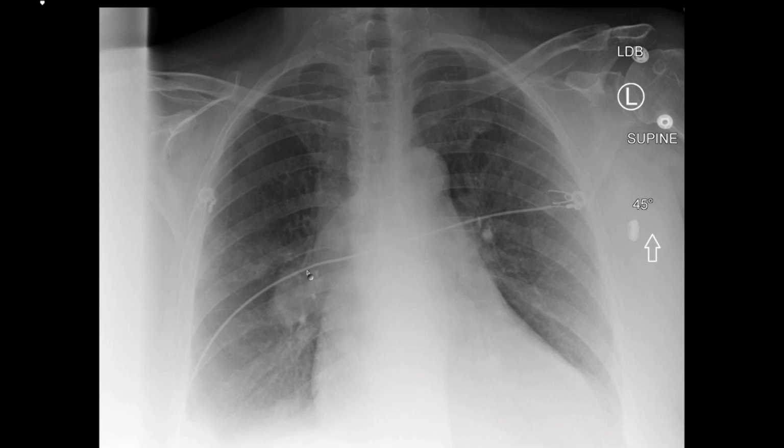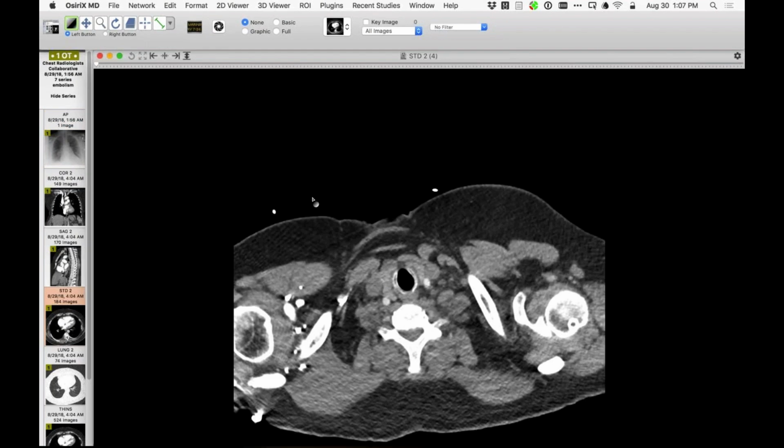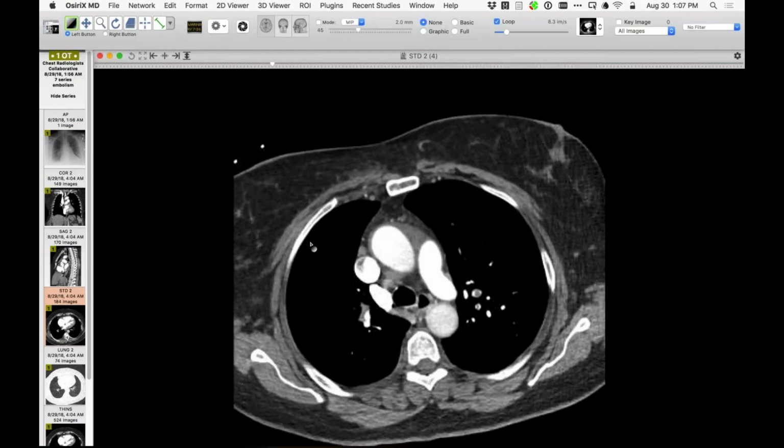The distended pulmonary arteries, if it was right over there, would be the Fleischner sign, but certainly this involves the proximal descending right pulmonary artery, so it should be the Palla sign. And then, of course, because of right atrial hypertension and a big pulmonary embolism, the distended SVC and azygos vein reflect that very nicely. So yes, indeed, this patient has very substantial pulmonary embolism.